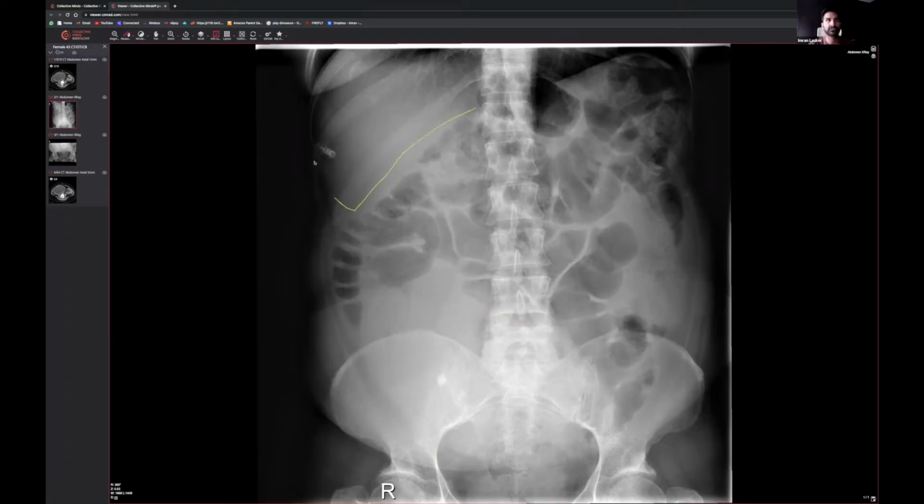Obviously, you've got other shadows to be looking at. You've got your liver, your spleen over here, your gallbladder over here, your kidneys over here, and the urinary bladder quite centrally. But this mass appears to be slightly different. It doesn't seem to be coming from the areas where you'd expect the normal anatomy to be. So if your normal anatomy doesn't conform to what this lesion is, then you've got to start thinking about what else this could be. So something in the pelvis.